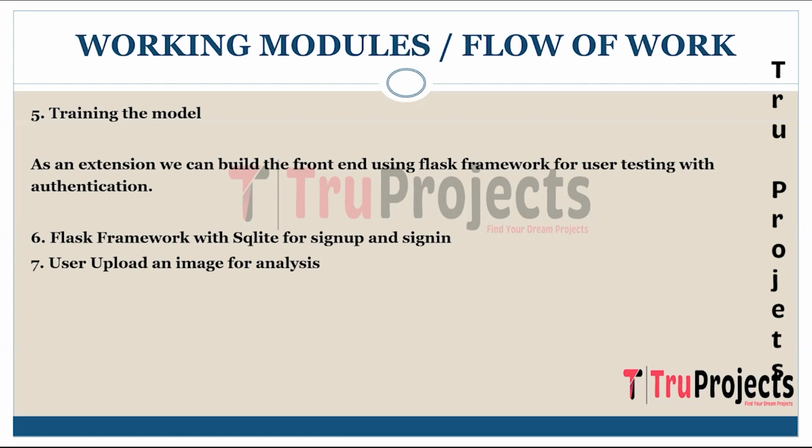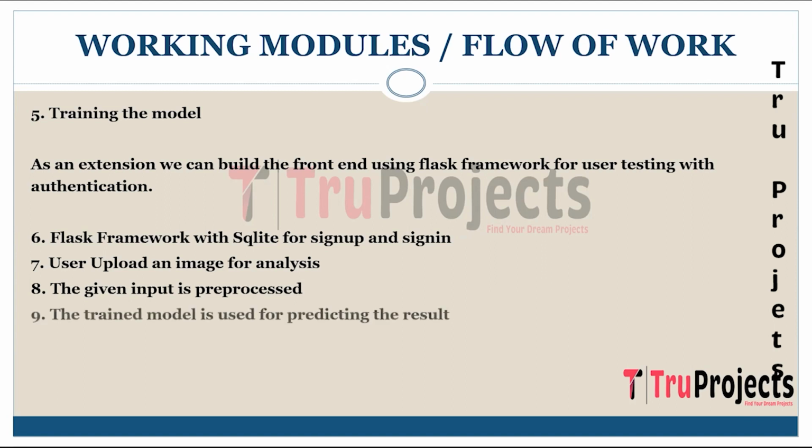Coming to user upload and image for analysis, users are empowered to upload their retinal images through the web interface. This interactive feature enables individuals to have their images analyzed by the system. Image preprocessing, in which the given input is preprocessed. Similar preprocessing techniques as those applied to the dataset are used to prepare user-uploaded images. This step guarantees that all images are brought to a uniform format suitable for analysis.